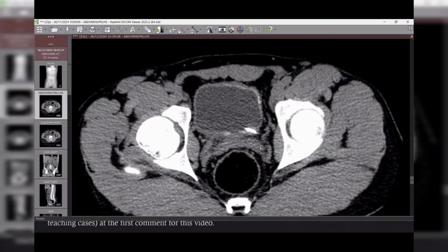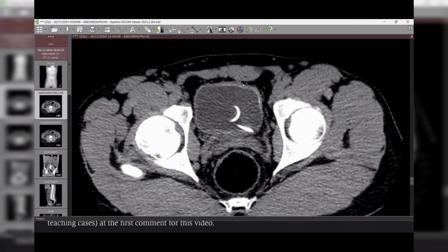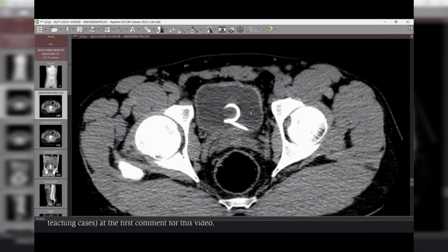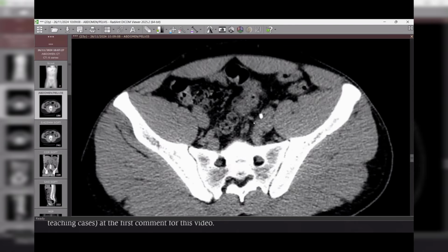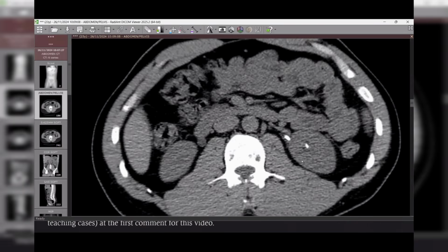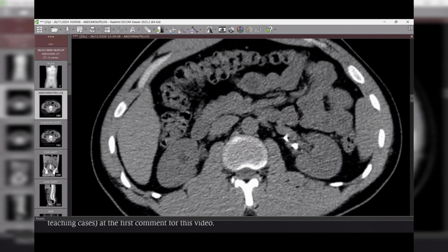Yes. Bilharzial and tuberculosis. Tuberculosis can cause calcifications, but these linear calcifications are seen with bilharzial. Tuberculosis can be irregular, nodular calcifications, and also most likely associated with ipsilateral renal calcifications and destruction. We don't have anything in the kidneys.